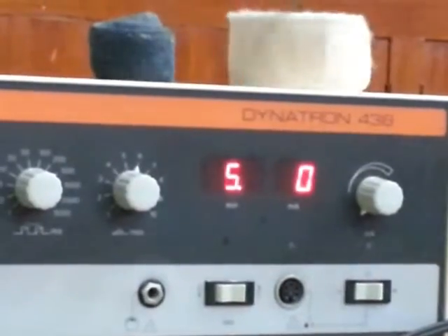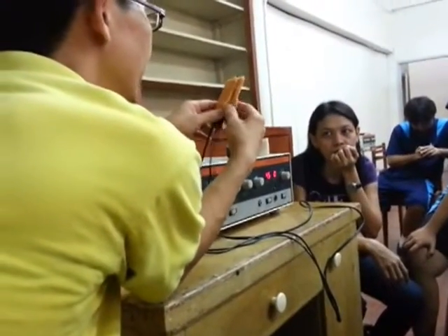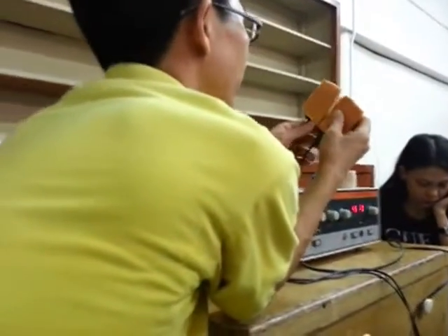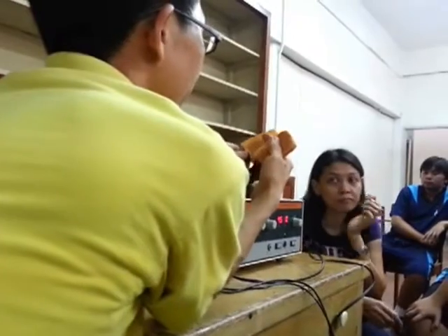Okay, so here, after the machine, you still have the cable. This is the cable wherein you're going to attach the electrodes. These are the electrodes, and they should exist in pairs, as partners. You cannot use just one, since it would render the circuit open.